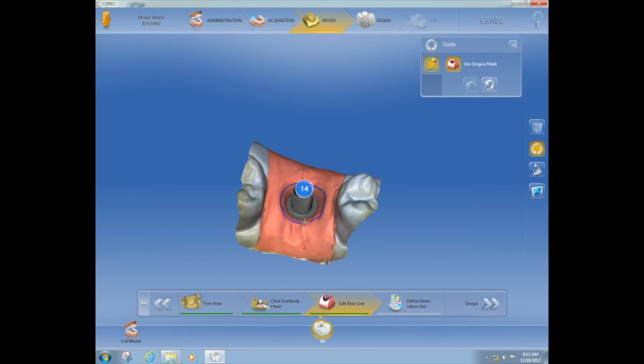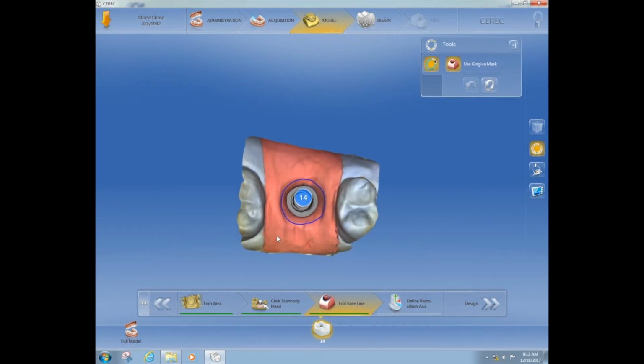On a posterior implant, no one seems to take the time to actually mold the tissue anymore, but if you've got a nice tapered healing abutment that has some shape, this will be formed very well. If not, you're going to get a cylindrical tissue form, and then you'll have to use a laser or some other type of tissue contouring.